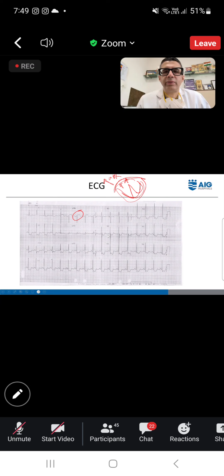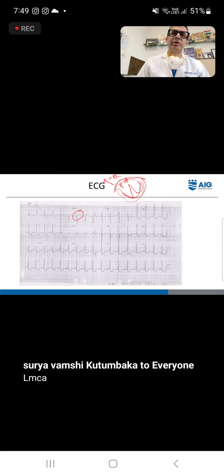So what is your suspicion with this ECG? Whenever you have a global ST depression and aVR ST elevation, you should always suspect some kind of severe ischemia. Severe ischemia usually can be because of left main, or it could be because of a severe triple vessel disease. So why a 16-year-old should have this is a second question. But just because she's 16 years old, you don't say that everything is normal and send her home. This can kill the patient, right? So then she was admitted.